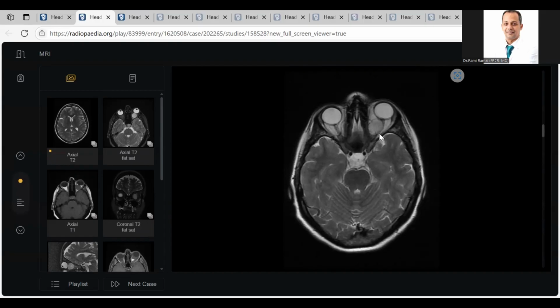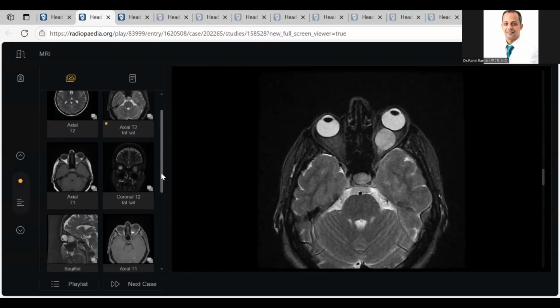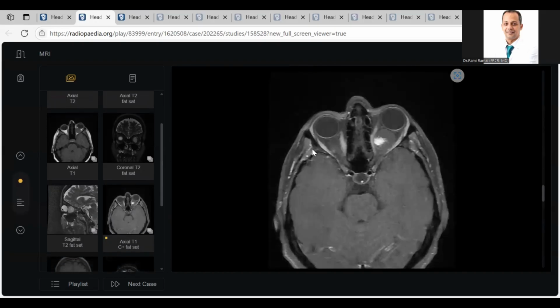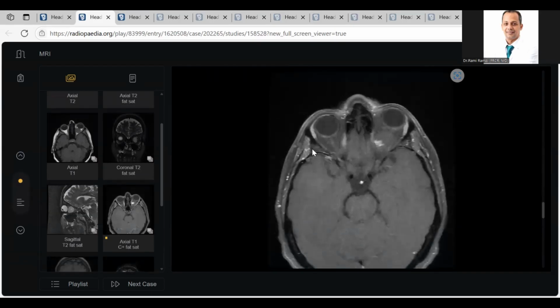From the start, you told me this is a cystic lesion. Look here, it looks like not cystic, maybe solid. We don't know. But you can tell me, doctor, this is a bright lesion. After you revise all or most of the sequences, tell the examiner this is cystic-solid.